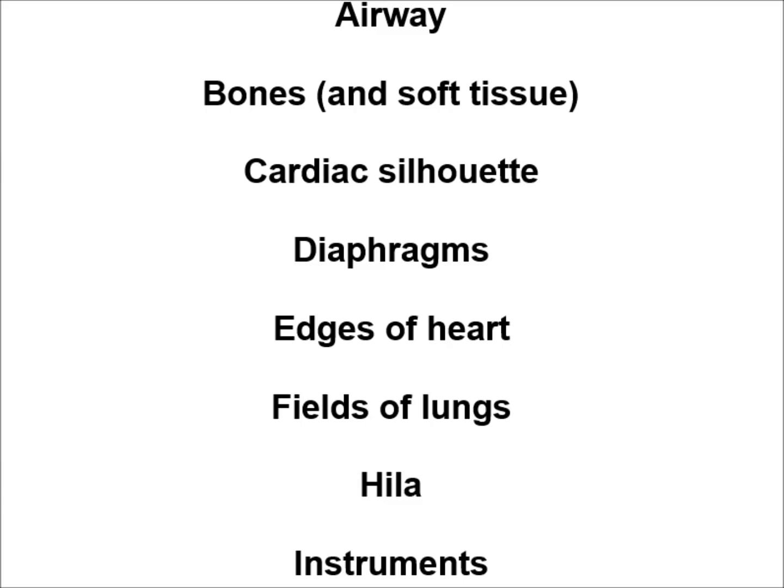E. Check that the edges of the heart are clear. F. Check the lung fields for normal lung markings and abnormal shadowing. H. Check the hilar for lymph nodes or masses. And I. Look for instruments.